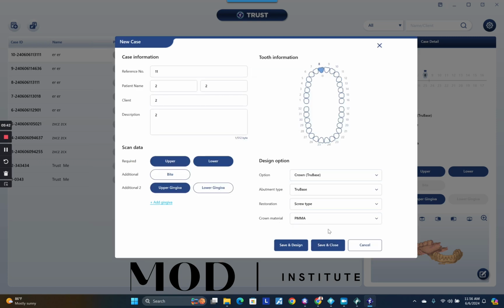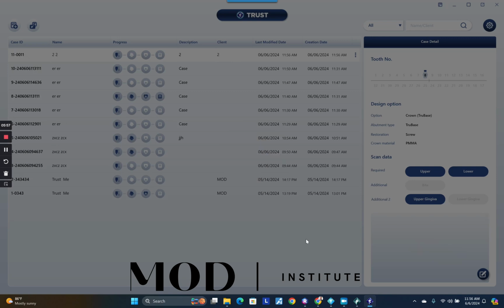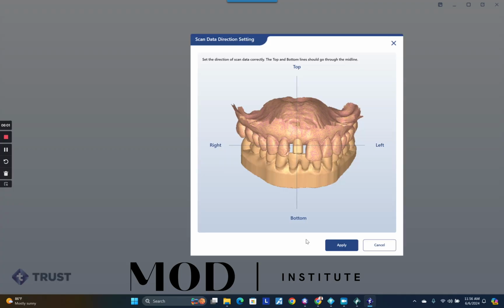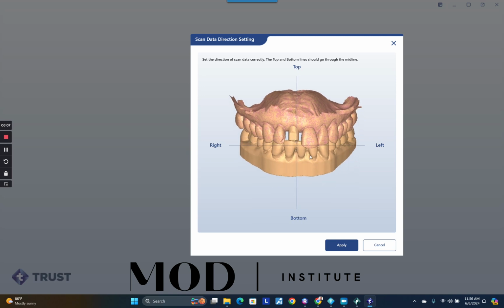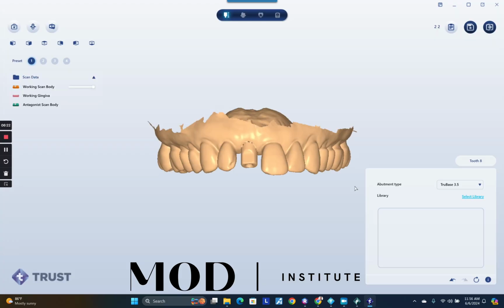And then now I'm changing to tie base, and they have the variable height tie bases, which are phenomenal. Usually once just locked down to only CEREC users, but the custom variable base tie bases are awesome. GH1, 2, 3, and 4. So now we're going to rotate the model, and you want to be looking straight on with your model to where the crosshairs are right on the midline and right on the incisal edge of 8 and 9.